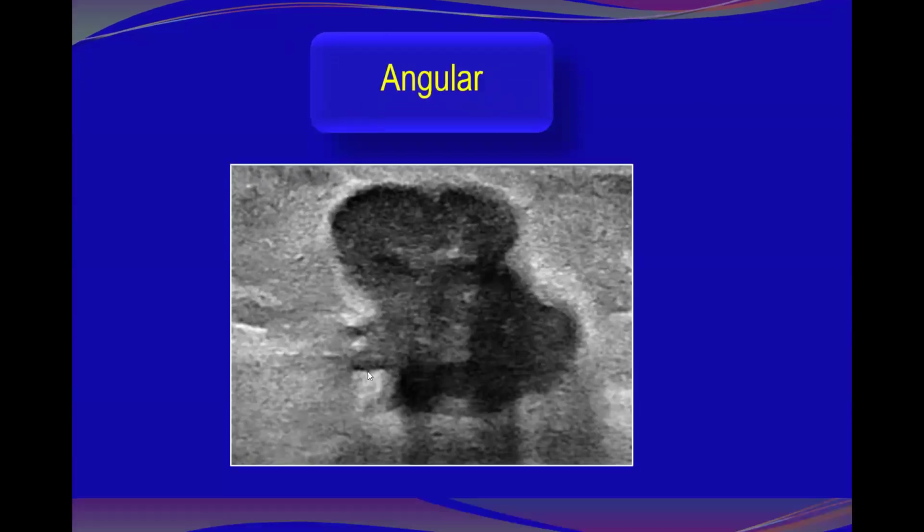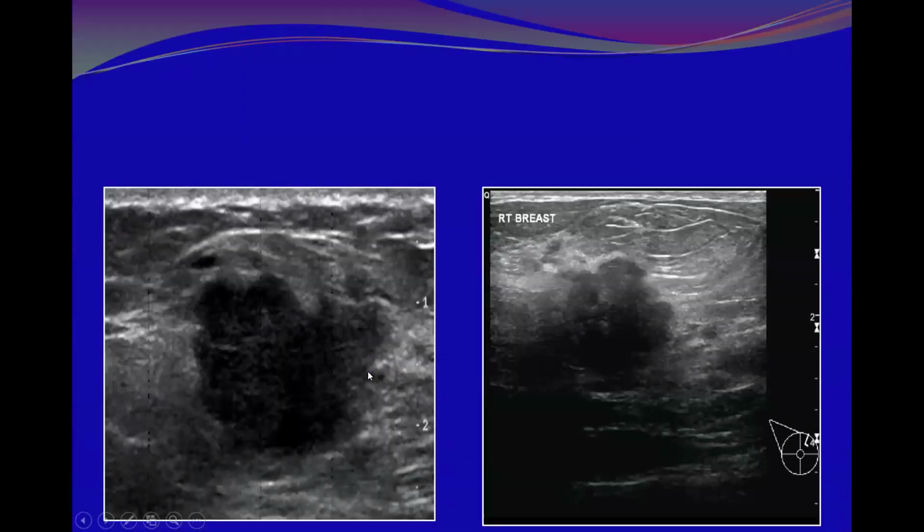And this one, the margin here, this is irregular, non-parallel, and the rim, look for the thickness within the same lesions. Here is thick, here is thinner, non-uniform, giving indistinct margins as well as these angular margins. These are angular margins. Okay, and here the margins.